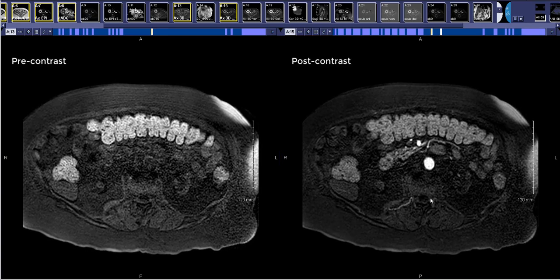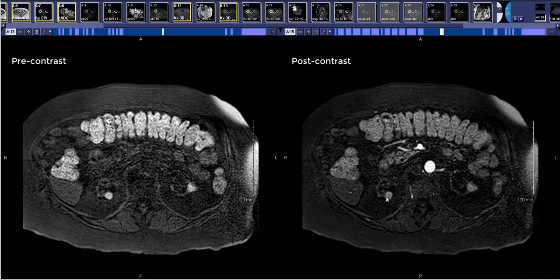So on this post contrast image here on the right hand, you can see this renal mass here is high signal. And you don't really know, is that T1 hyperintensity from a hemorrhage, or is it T1 hyperintensity from an enhancing solid component? So you look back at your T1 pre-contrast, you can see that it was hyperintense, so you suspect that it's all hemorrhage. But what if it's a hemorrhagic renal mass, which those are not rare? So to ensure that there's no enhancement within this, we do something called subtraction imaging, which is, in my opinion, absolutely necessary for every renal mass protocol MRI you read.